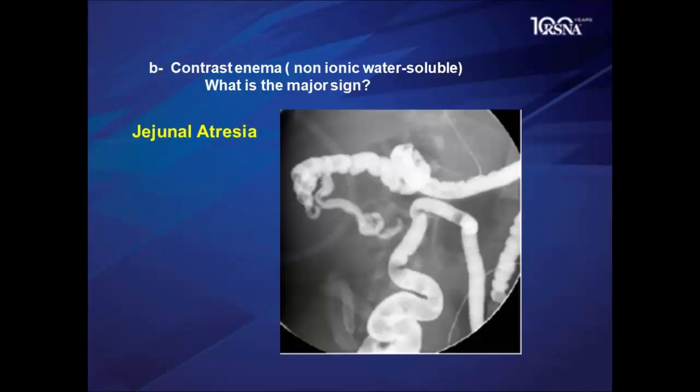Then, because many bowel loops, one would perform enema. It shows the colon not really used, and then we have a small size of distal ileum, but the gas-filled bowel loops in jejunum are still dilated. So the process is not in the colon, it's unlikely in the ileum, but in the jejunum.